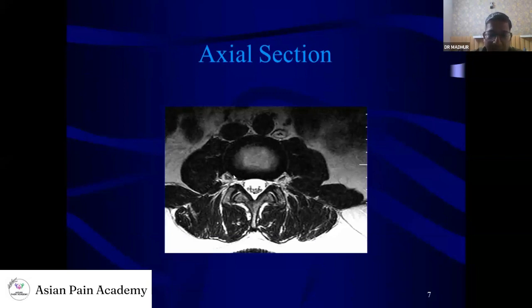Then we can see the lumbar canal. The lumbar canal is triangular in shape, in which we can see this round structure is the thecal sac. And these dots are actually the nerve roots. The sacral nerve roots are situated posteriorly, and lumbar nerve roots are situated anterolaterally. These are the neural foramina, through which the nerve roots are exiting. You can very well see these on the axial images only. This is the superior articular facet. This is the inferior articular facet. This is the lamina, transverse and spinous process. So the entire anatomy which we just discussed can be better seen on the axial images.